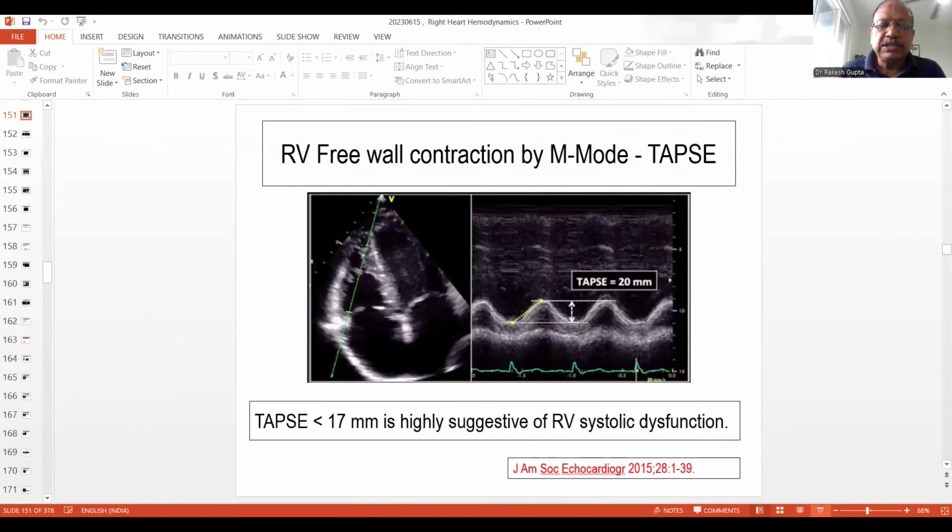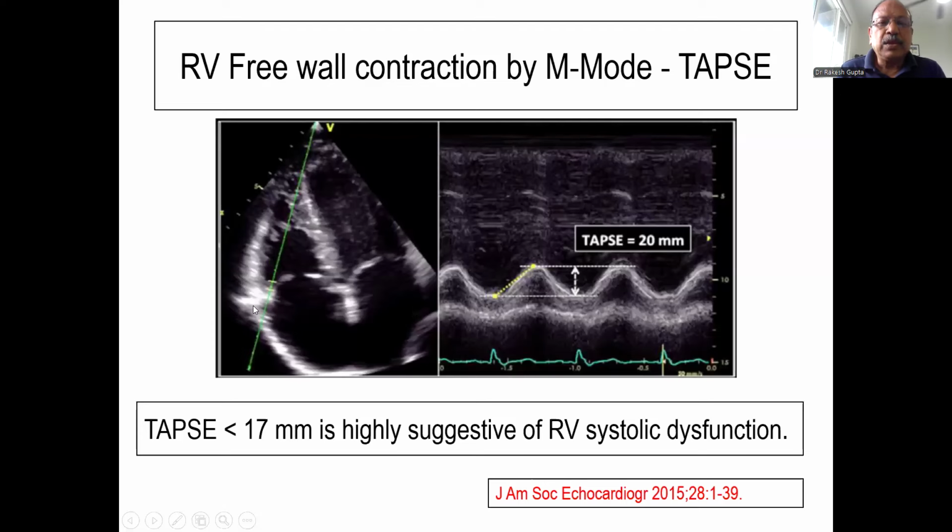Now, Sachi, look at this slide very carefully. You can see the slides, right? Can you see the slides, Sachi? Yes, sir. Right. So if I put my cursor over here, I'm looking at the forward contraction. My apex is fixed. My base moves toward the apex. So this annulus will move towards an apex to give you a forward contraction of this annulus movement. Here is the forward contraction of the annulus movement.